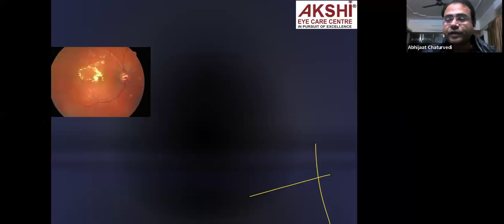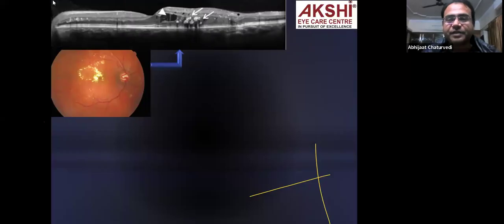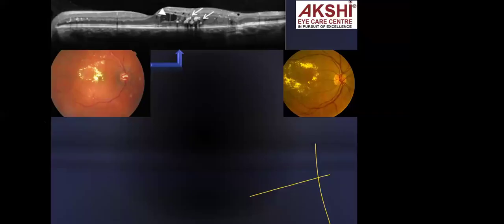This is a case showing somewhat moderate to severe NPDR, and when we went to quantify that CSME component, you can see in this image, there is some intraretinal fluid or cystic edema happening, some exudates there. Okay, and now you can appreciate this ellipsoid zone line, which is coming, and vanished. Now it's not there, it's very irregular. Okay. Now, why I have put this slide, try to focus on that important part.